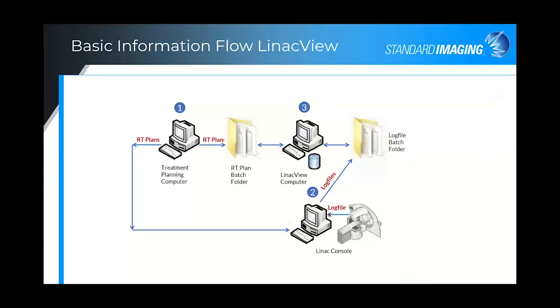And so just to get you oriented, the RTPlan, of course, has control points, and then the log file is monitoring the plan delivery. And there is more granular information associated with the log files than there is the RTPlan. So now I'd like to go into some more details about the RTPlan control points, which are much more sparsely spaced, and then discuss a bit further about the log files.